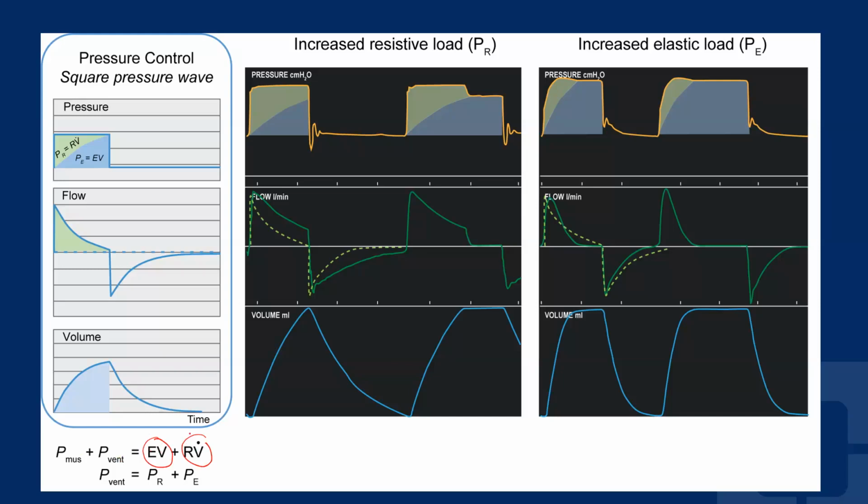The ventilator will then adjust to maintain that, and you will see these oscillations. I'll show you in the next image. The same that happens here, we could amplify this image, and you're going to see oscillations throughout, because the ventilator is trying to control the pressure throughout the breath.